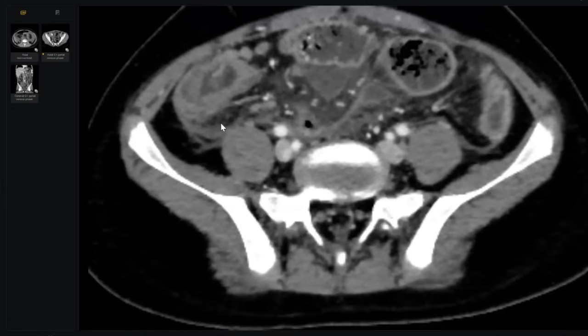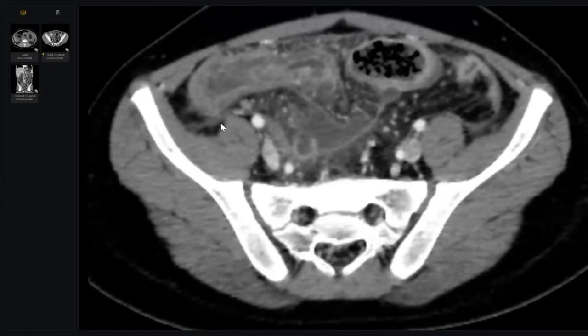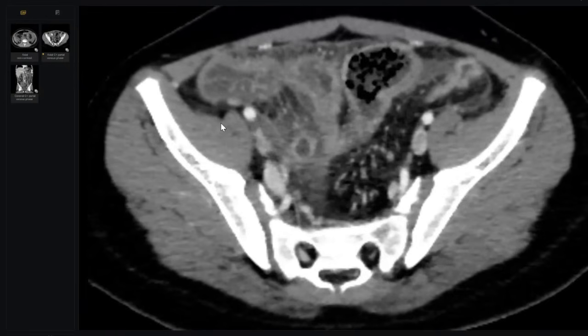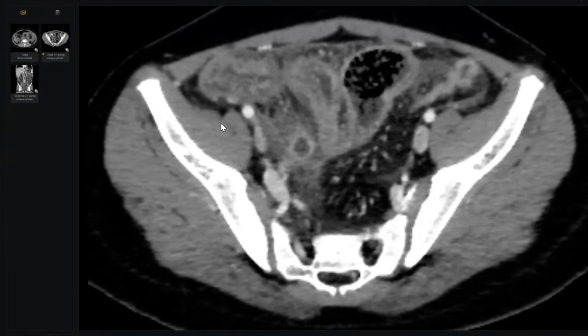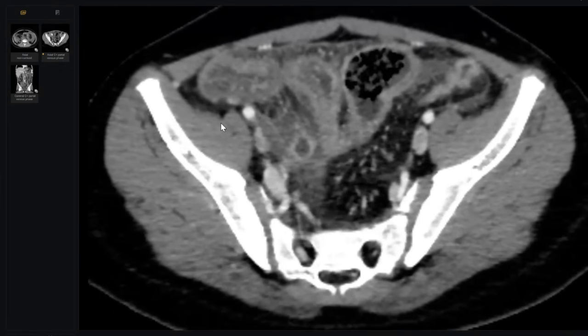Sir, this could be, in young patients, we can have another tubular blind-ended structure that arises from... Are you sure the second one is blind-ended? Look here. Yes, sir, please, can you scroll up? It shows mural enhancement. Concentrate on this, please.